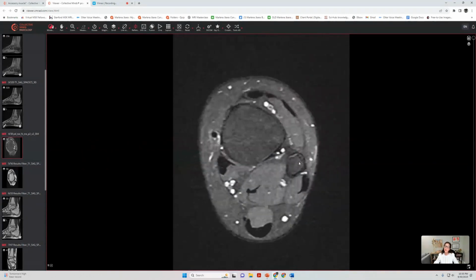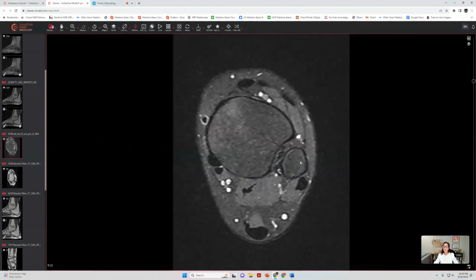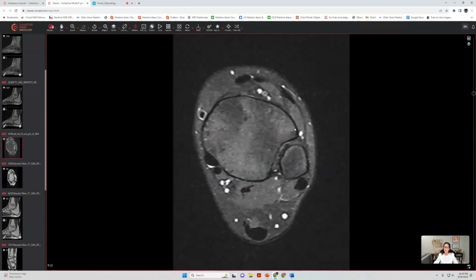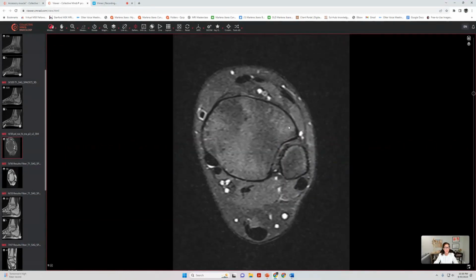Moving on to the important lateral ligaments that can be seen on an axial image, from proximal to distal, let's evaluate the superior syndesmotic region. In this case, we can see it as thin, low signal wispy bands because it's normal.